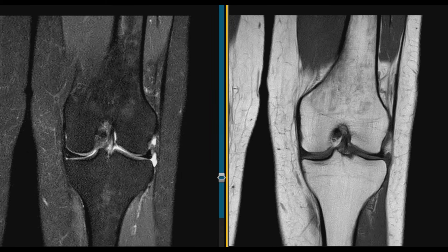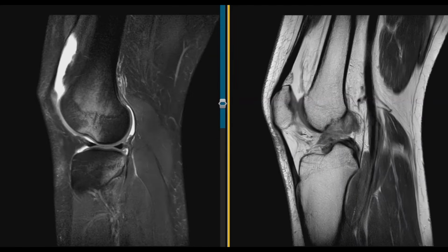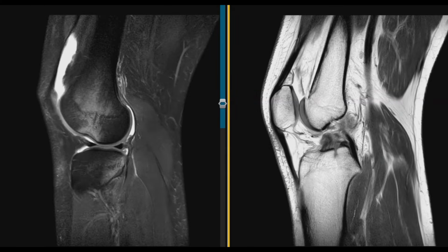Now we're going to find the patient who has the ACL tear. And here it is. So this patient has a torn anterior cruciate ligament. This is the ACL coming down here. Normally we see a nice dark band like the last patient. In this patient we see this fog, this poorly defined region of intermediate signal intensity. And if we look more closely and window it, we see a little curved linear band here. This is the ACL that's torn and folded forward upon itself.